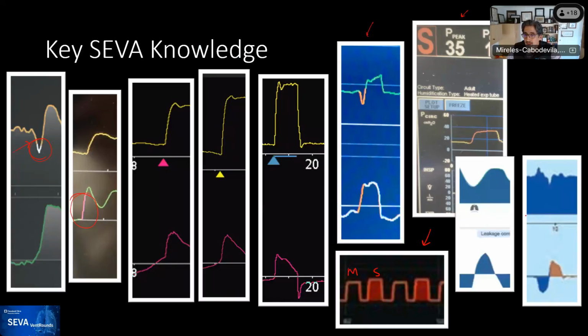And then here on the two white screens, or these two examples over here, those are Dragers. And the Dragers have different presentations. In one, they put this little set of lungs with a diaphragm underneath to tell you that it's a patient trigger signal. Or in other versions, it changes the color of the flow signal to tell you that it has been triggered by the patient. So all of these highlight that there's not a universal way that you get to see how the ventilator is triggering.